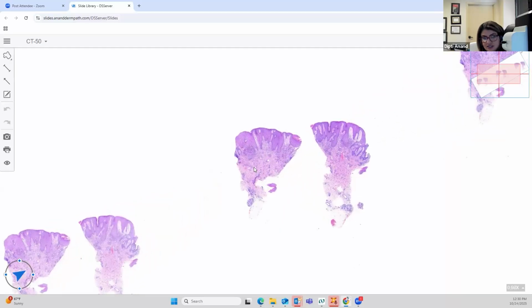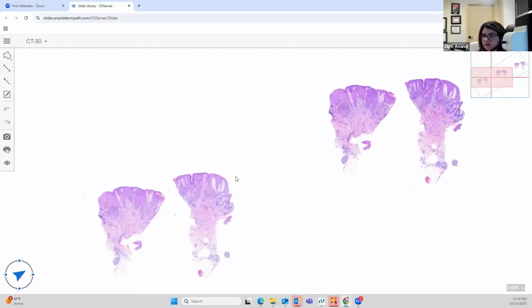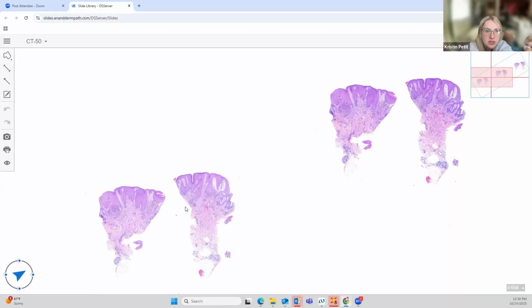Did you guys get this? Did anybody get this? Is this verruciform xanthoma?